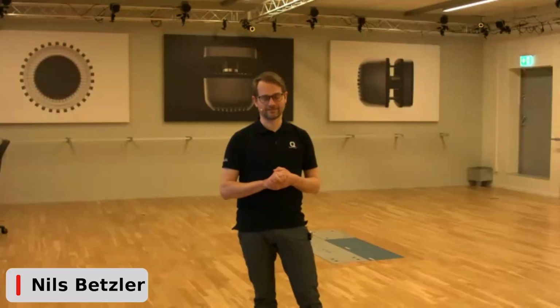So first, we'll be joined by our partners from AnyBody, who are located over in Aalborg in Denmark, and who give you a short summary of what the AnyBody modeling system is. And then we move on to do a full live demonstration of a new workflow that we have prepared to streamline the data capture all the way to processing in AnyBody. And then we'll wrap up with a Q&A session.